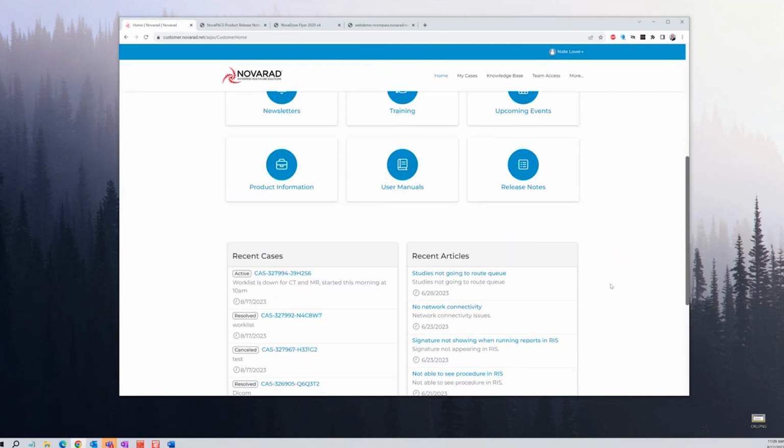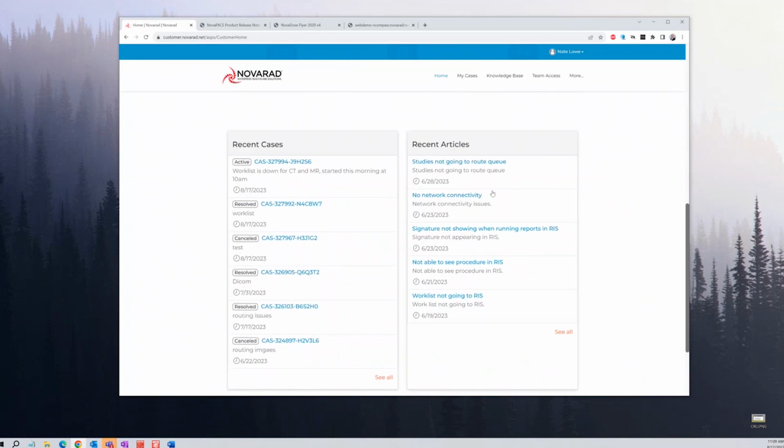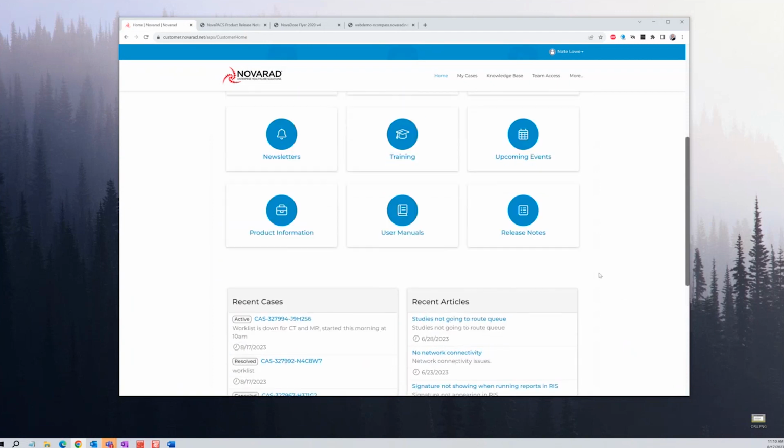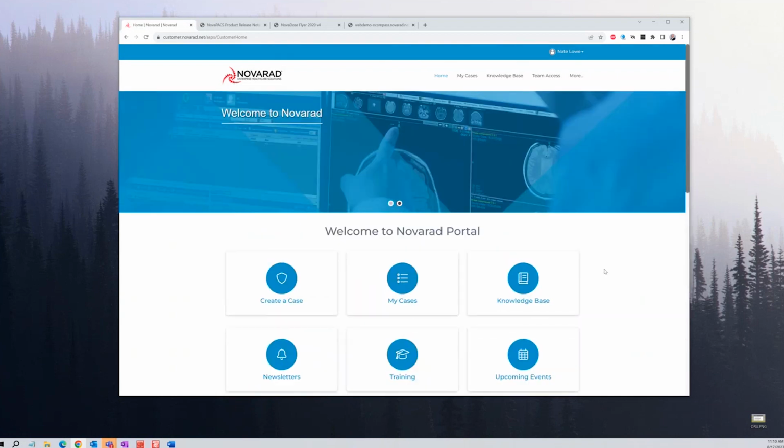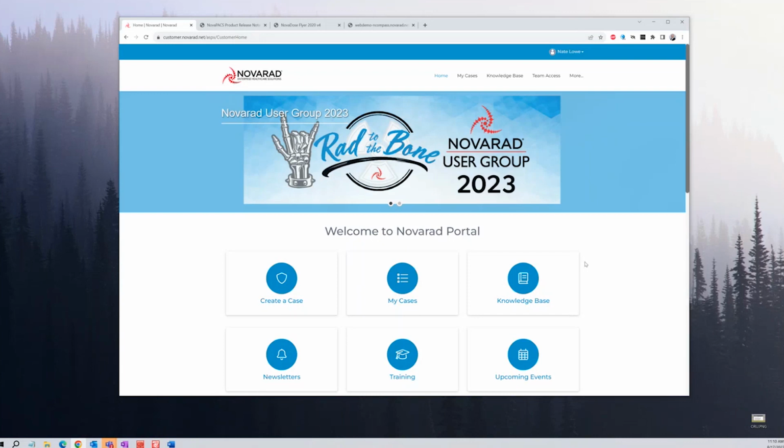The last thing is, this is just the most recent cases that have been worked on or opened or resolved, and these are the most recent knowledge base articles. So if you just want to log in and see what's new, just scroll down to the bottom and you'll see that. And that is pretty much it.